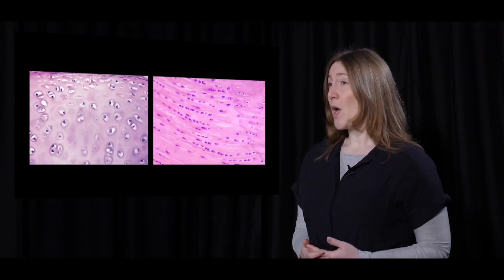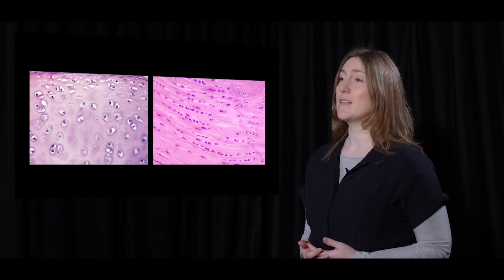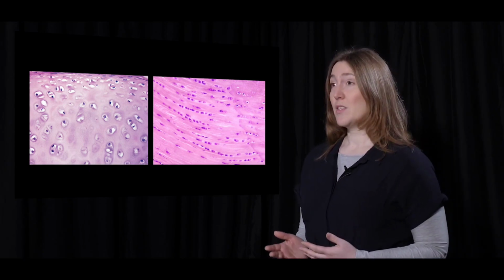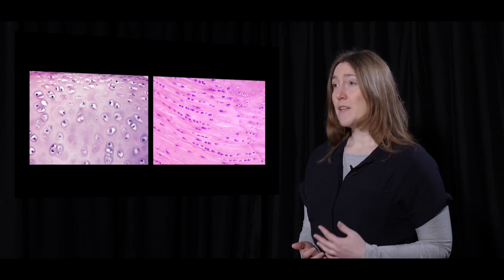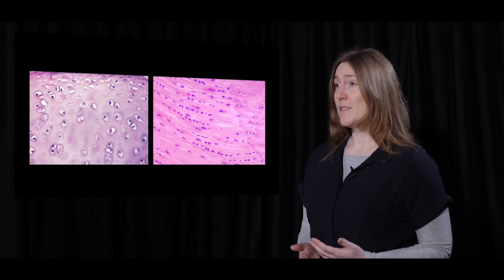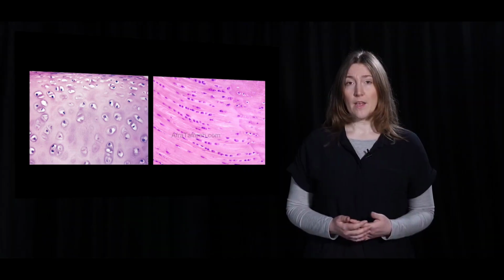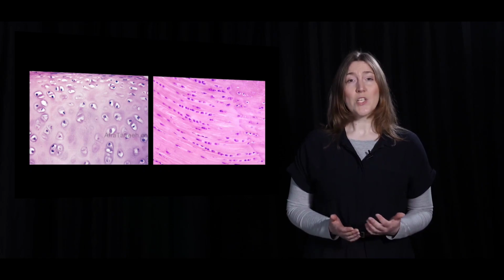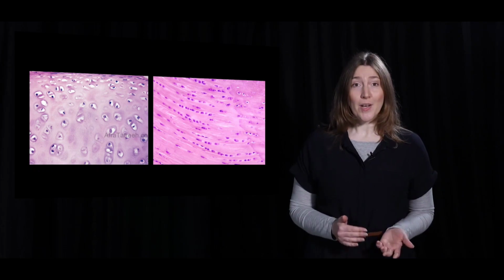Hyaline cartilage is not the only cartilage type that you frequently see in musculoskeletal ultrasound. Fibre cartilage can also be scanned. Hyaline, the left image, and fibre cartilage, the right image, are different structures. The main difference is that fibre cartilage contains more fibres, less water, and is therefore a harder structure. Knowing that fibre cartilage is harder than hyaline cartilage, which echogenicity does fibre cartilage have? Hypo or hyper-echogenicity?